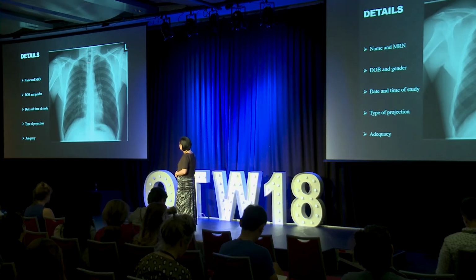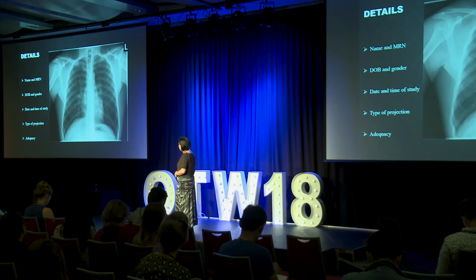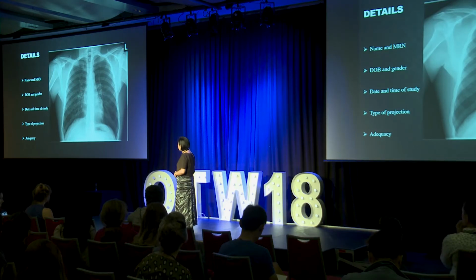The other review areas you'll also want to check are the apices. Sometimes you can have pathology that's a bit obscured because people forget to look up at the top, because the clavicles are in the way. Also the axilla, sometimes you might see a bit of a bulge, which indicates an axillary mass, and also underneath the hemidiaphragms.